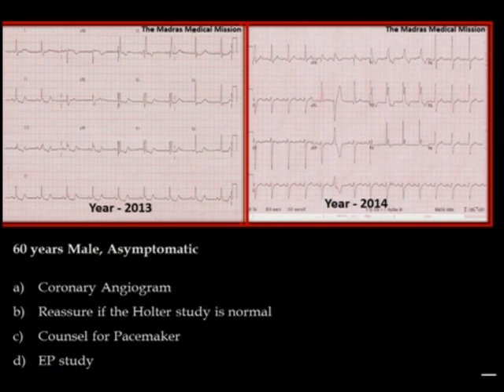In addition to the right bundle getting more diseased, another fascicle is also showing signs of degeneration in the form of a leftward axis deviation, which is a manifestation of left anterior fascicular problem. So you already have almost a trifascicular block, which, even though asymptomatic, is progressive. I believe this ECG, or this slide, is representative of the fact that it's better to always correlate with the past ECGs, and sometimes with the guidelines you have to read between the lines.